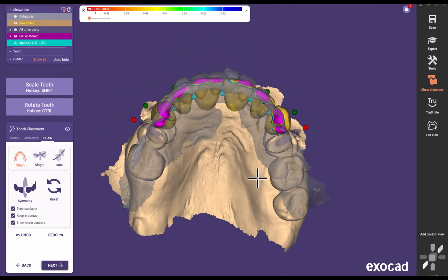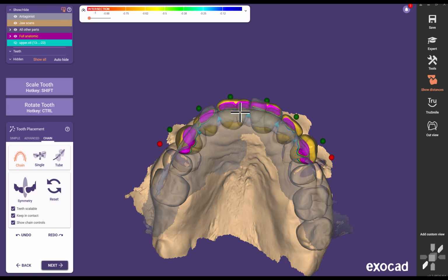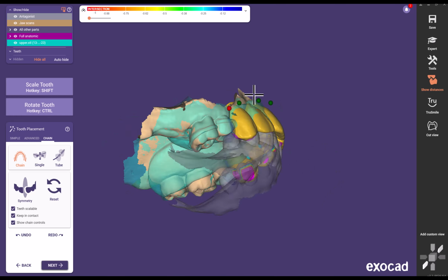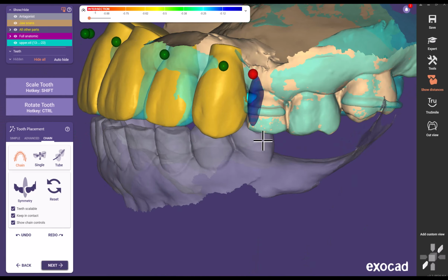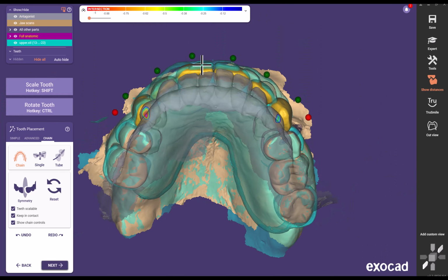And if in fact this is the right bite, we're going to clearly have to stretch these teeth out quite a bit to get them out there. And this is where it can be kind of useful to look at the pre-existing prosthetic that they've got. I'm looking here at how far facially those extend.